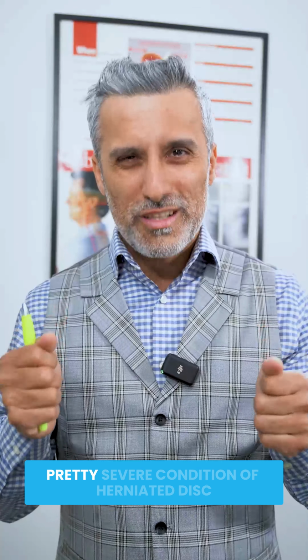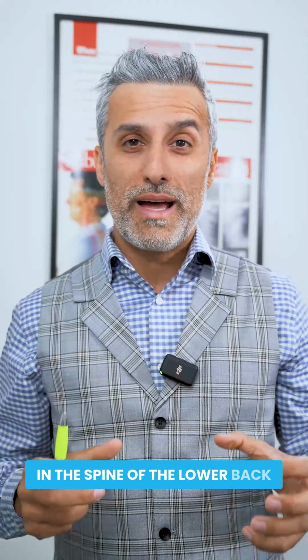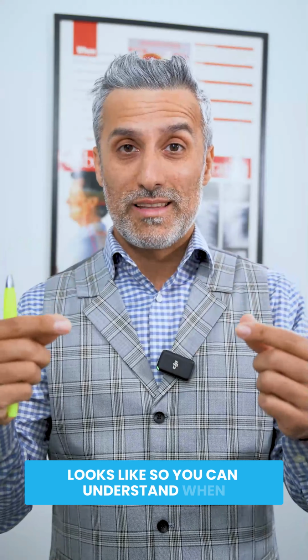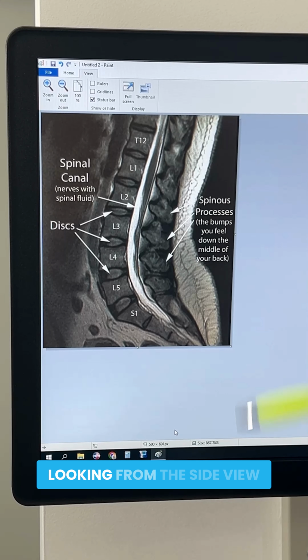I'd like to show you an MRI of a pretty severe condition of herniated disc in the spine of the lower back. Before I do that, I want to show you what normal looks like so you can understand when we're looking at abnormal. So this is a normal spine looking from the side view.